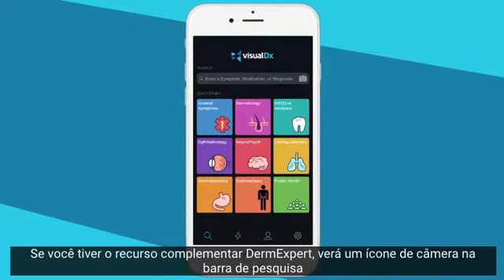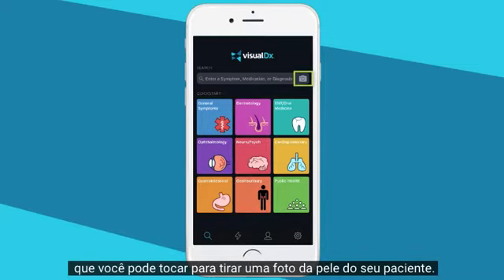If you have the Derm Expert add-on feature, you'll see a camera icon in the search bar, which you can then tap to take a picture of your patient's skin. Watch our Derm Expert walkthrough to learn more.